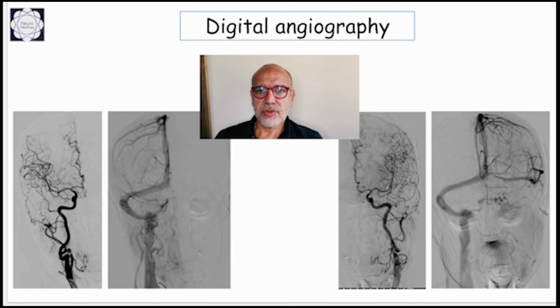That may be due to a normal variant, but when we injected the left internal carotid artery, there is no opacification of the internal jugular vein and no opacification of the left sigmoid sinus. There is a reduced contrast opacification of the left transverse sinus, dilation of the supratentorial cortical veins, maybe due to collateral circulation, and normal enhancement of the right side veins.